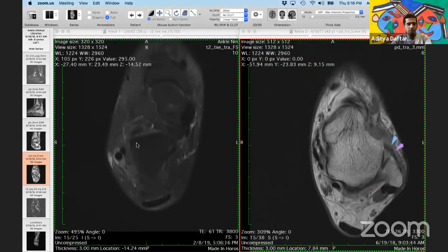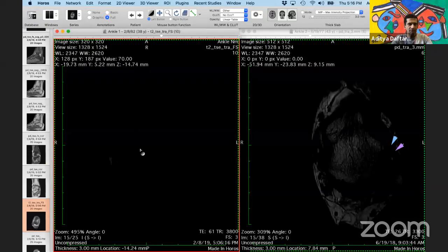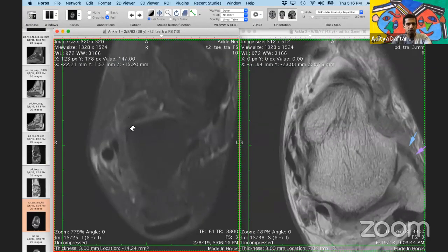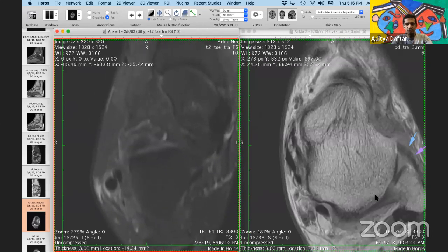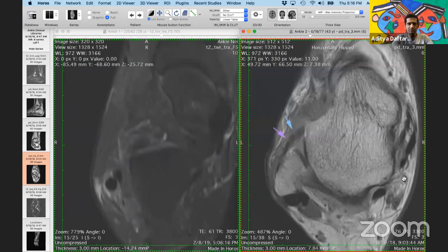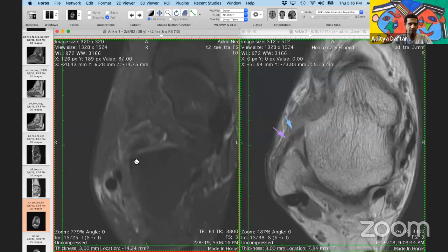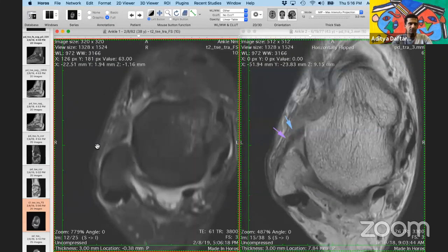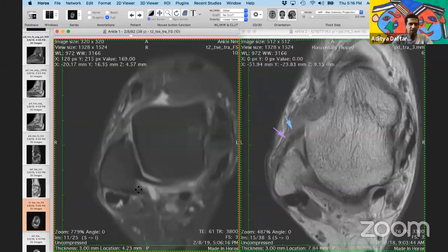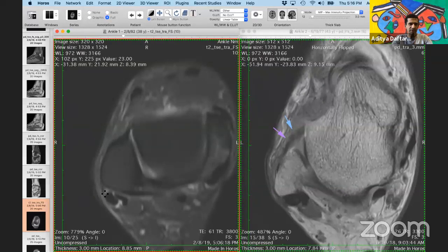Okay, so these are two different patients with ankle injuries. I'm going to flip this horizontally so that you see both on the same side. So this side is lateral. Can you see, Mama? This is lateral. Yes. Okay, so this is lateral here, and basically as we run down these are the peroneal tendons at the back here.